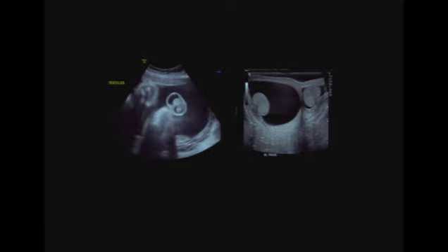Here are images of a fetal scrotum in which a large hydrocele is seen, although one can see very nicely the two testes that are normal, and the linear echogenicity within the testicle is the mediastinum testis. And this individual, as a neonate, shows a large hydrocele on the right and a smaller hydrocele on the left, and the testes appear completely normal.